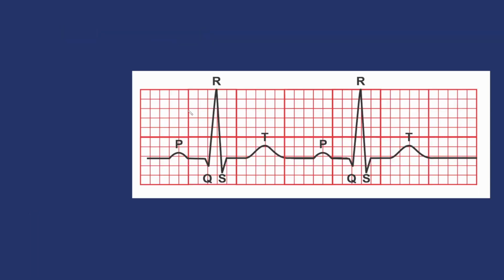Okay. So now before we get into fully applying that and looking at how we're going to do that for our EKG, we're going to go over how the EKG is set up in the first place, because we have a bunch of different boxes and times and everything. So in general, we're going to have two axes, right?